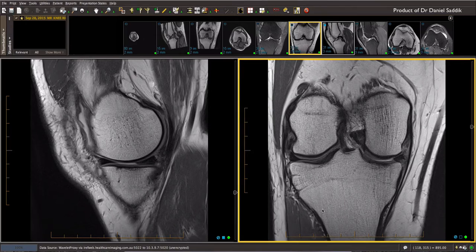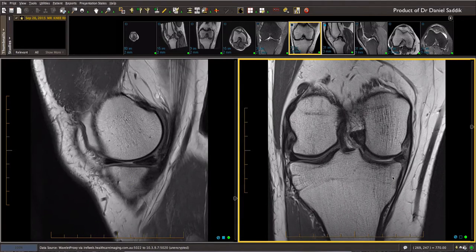If you say there's a medial meniscal tear, the surgeon will say, look, that's where his pain is, I'm going in. But there's a little bit of a catch here. Sometimes this fragment may not be appreciated. They might dig around for it, probe underneath here and try and push out a fragment, but sometimes it may not be appreciated surgically, and that's why you have to make sure that the surgeon knows about it, because there's no point having a go at this part of the meniscus and trimming it away and then leaving this fragment here, because the patient will still likely be symptomatic.